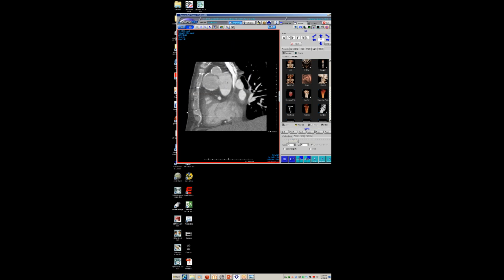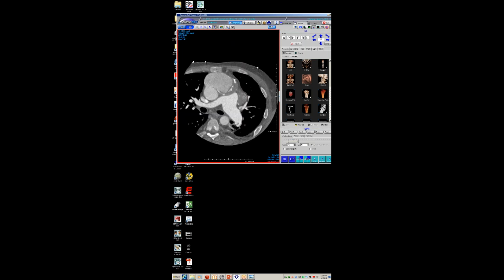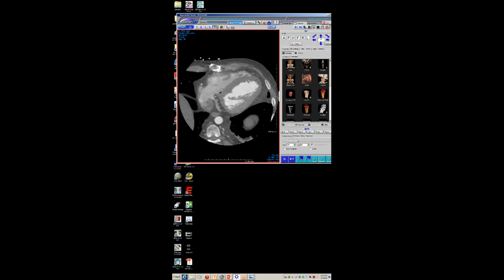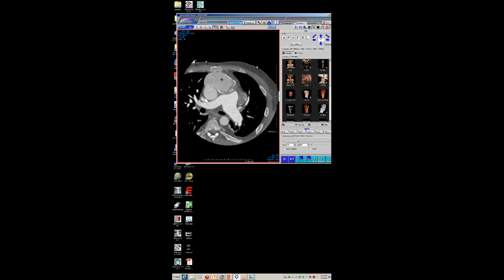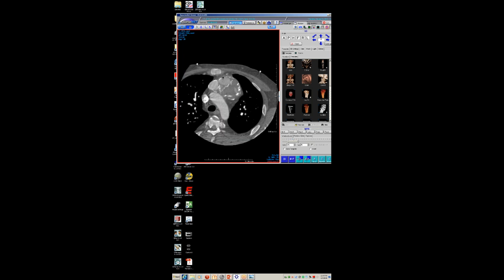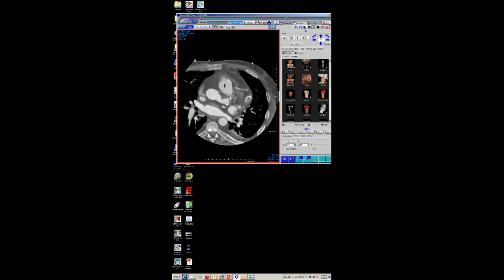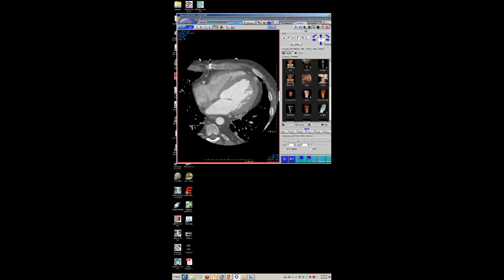Here's a kind of sagittal view where there are these two very large defects in the aorta, presumably at the aortotomy sites where they put these things in. And then the grafts themselves are just diffusely aneurysmal and thrombosed. I wouldn't know whether to call these aneurysmal, or whether there's a pseudoaneurysm component or not. But anyways, that's just a pretty impressive case.